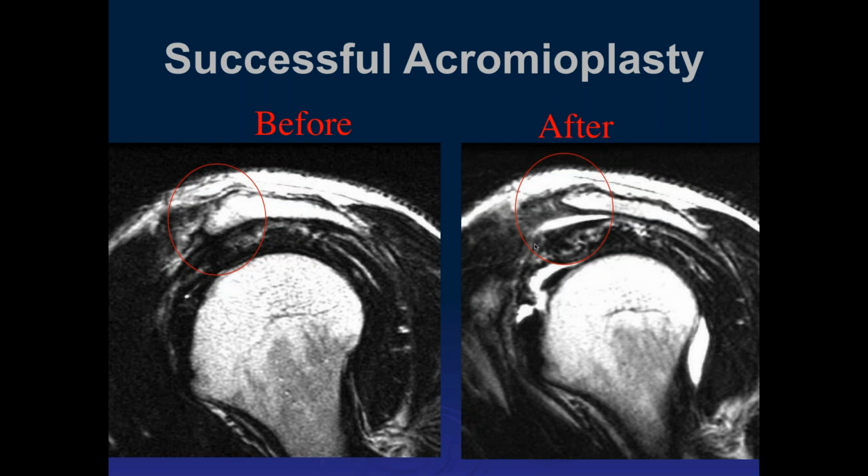You think that's much of an osteophyte? No, I really felt that this was the AC joint, and that was just a little bit of widening of the acromion at the AC joint, which was on the next cut. But surgeon, I don't think I would touch this acromion. Yeah. Now, one thing, it is like between type 2 and type 1.